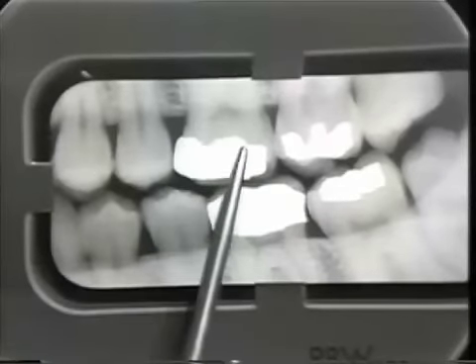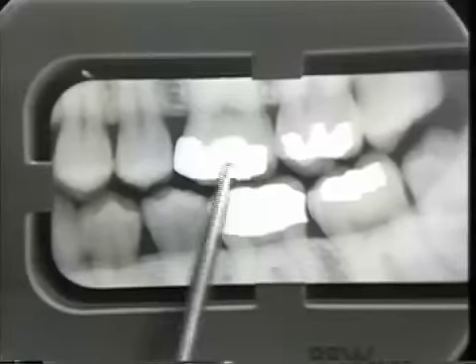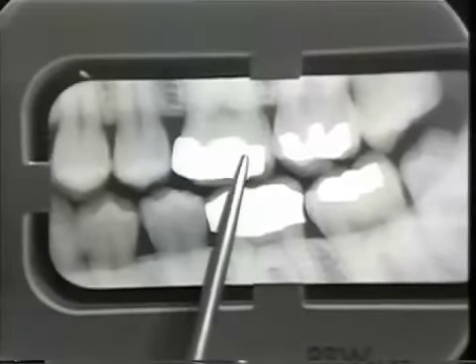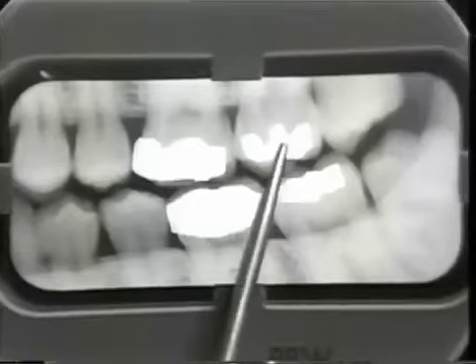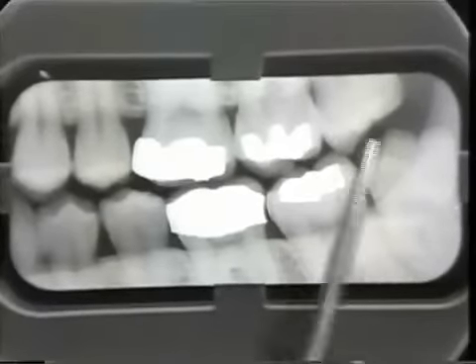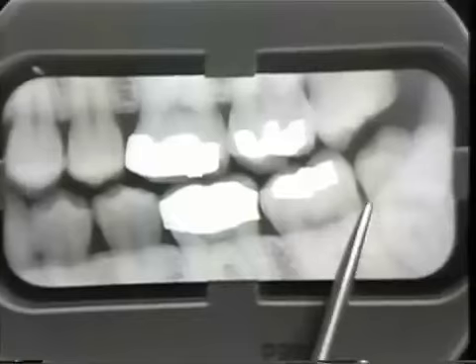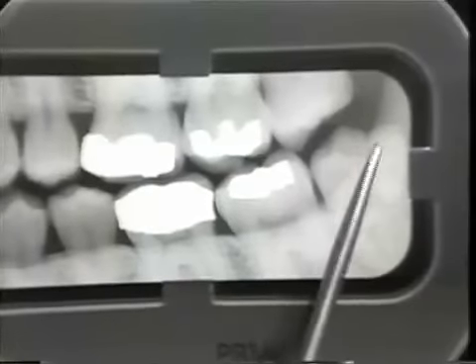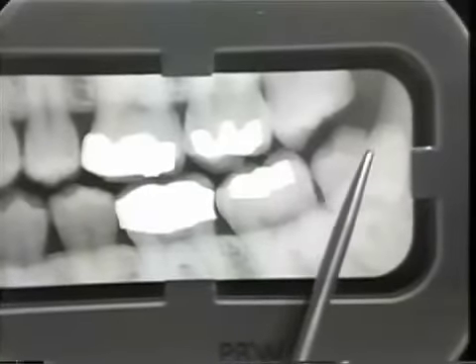A cement base is evident because it is a slightly lighter situation than the metal restoration. It is a little more radiolucent. Another restoration on 15. 16 and 17 show a rather crowded condition. The height of the alveolar bone is evidently coming up right through the center of number 17. This looks crowded.